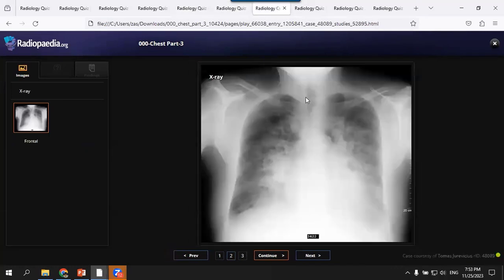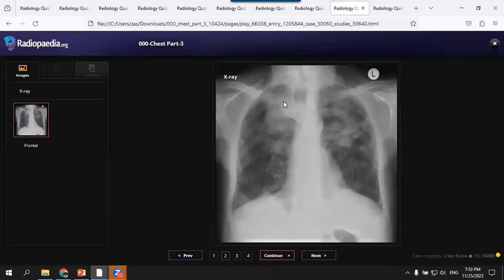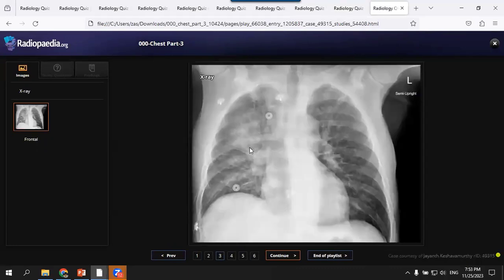Okay. And the batwing pattern, patchy opacities, perihilar with cardiomegaly, may be pulmonary edema, cardiogenic; normal heart, trauma, intracerebral hemorrhage, non-cardiogenic; and apical patchy opacities with volume loss, may be tuberculous, may be progressive massive fibrosis; unilateral, may be pneumonic, may be unilateral pulmonary edema.